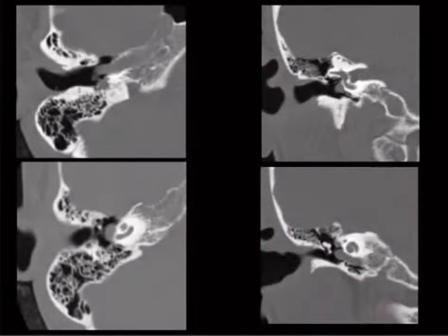Now, throughout this entire lecture, understanding that most people don't have a good grasp of the temporal bone anatomy, what I'm going to do is show pathology with normal ones next to it. So let's go ahead and do that. So, normal, labeled normal. I'll give you a second to look at it.